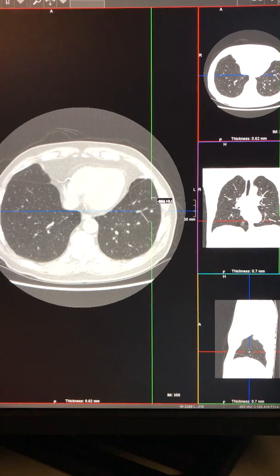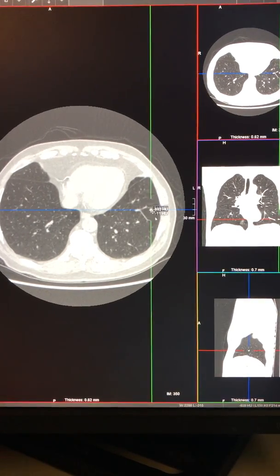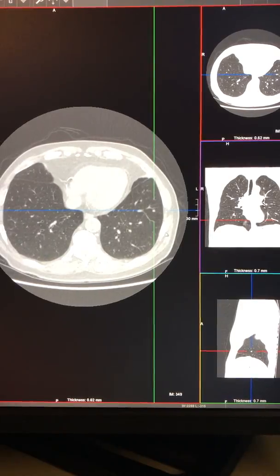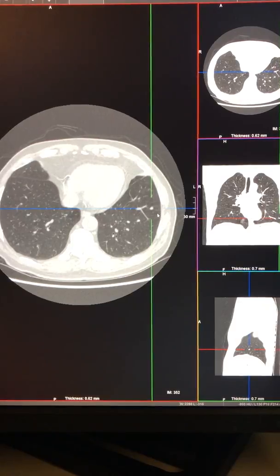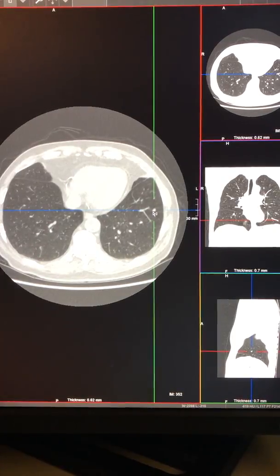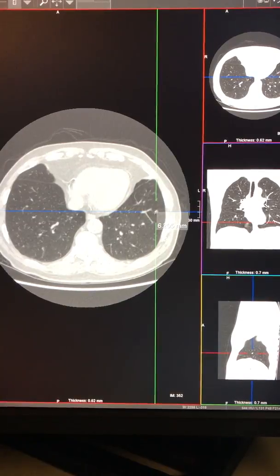It is also useful to learn how to measure these and how to analyze them correctly. We're going to use the Fleischner guidelines from 2017, and in this case it is recommended that the longest axis measurement is used, ideally in the axial plane. In this case we're going to measure it in this direction, which is the longest axis, coming to around 6.2 millimeters.